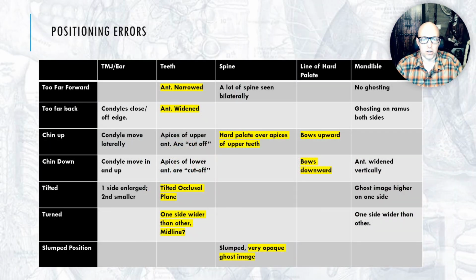All right, positioning errors. I've highlighted the things that I think are the most dead giveaways for whether the patient is positioned too far forward or back, or any of these other things. And we already talked through these things. Too far forward, too far back.